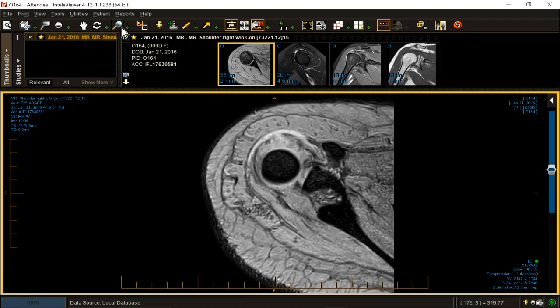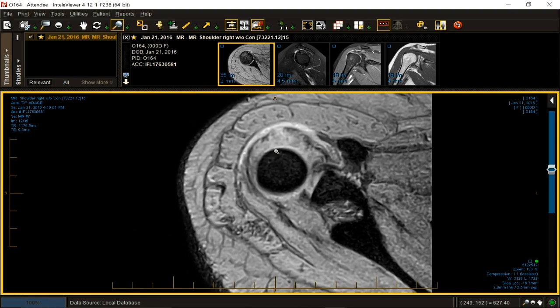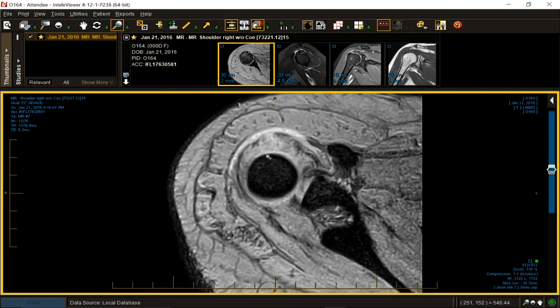So immediately I am drawn to the area of abnormality. I'm like you. I'm working. I've got to keep my job. I've got to be moving and grooving and not spending an hour reading this case and getting the answer right. Swollen, diffusely. Where are the internal fibrils of the tendon? So whatever it is, it's confluent.